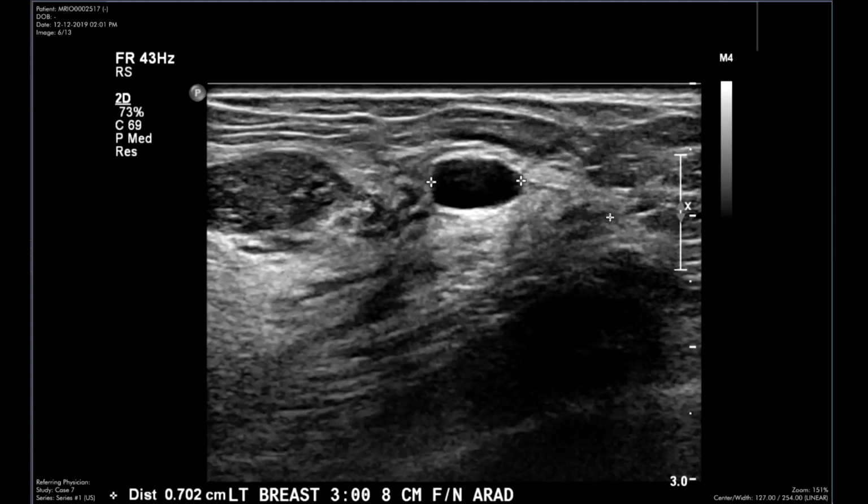It's not a simple cyst like I showed before, where we felt confident that we could just give it a BI-RADS 2. Instead, we describe this as a complicated cyst. It's important to make sure that there's no solid component. If there's a portion of it that's solid, that would be described as a complex cystic and solid mass, and which should be given a BI-RADS 4. But this is a complicated cyst, so we would want to give a BI-RADS 3 and follow it.